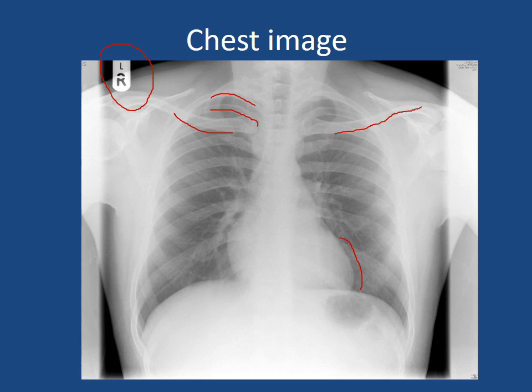Because the lungs are full of air, they're less dense than the bones, and because of that they don't show up as bright white. Because air is less dense than bone, it shows as grey on the chest x-ray images. So when we look at the patient's lungs, we can see them as being shades of grey. If you look at the lungs here, you can see that there are some slight white streaks in the image, and these are blood vessels within the lungs.